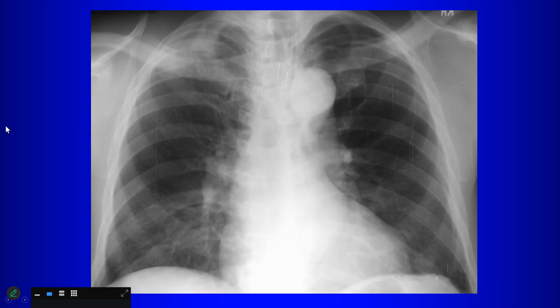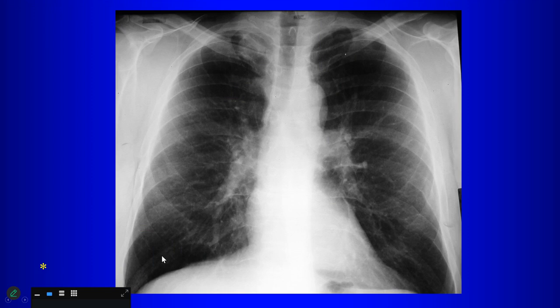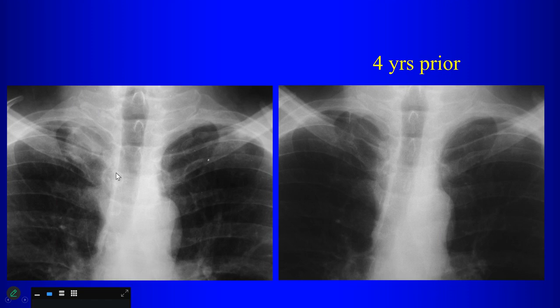So now that we know the game, when you're looking at this chest radiograph, what do we see? Right. Yeah, so there's an obvious mass here, right, in the right apex. So that's a cancer. What about this one? Again, in the right apex, when you look for symmetry, comparing this side to that side, right? And then what helps is when you pull out the prior chest radiographs.